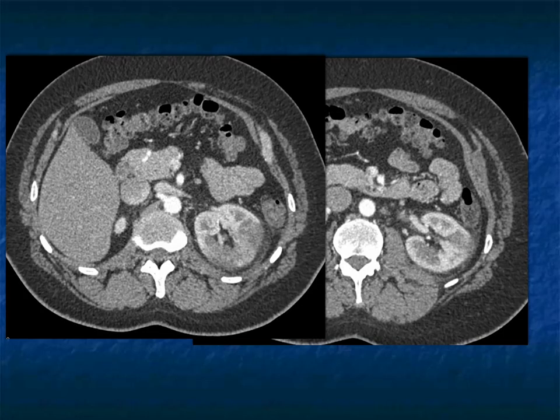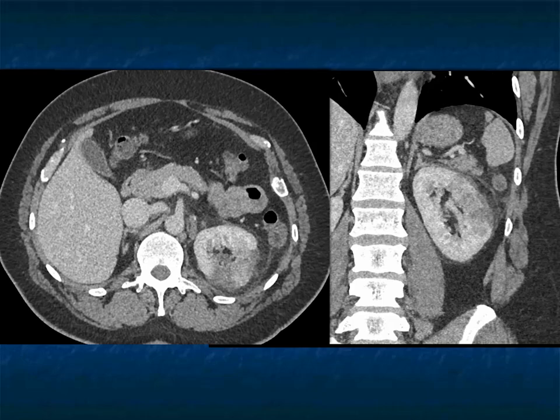When you give IV contrast, here's about a 30-second scan, corticomedullary phase. You see multiple areas of patchy decreased enhancement in the left kidney, very classic for acute pyelonephritis. The stranding, the low density, and the lack of sharp margins pushes you to infection. In case you were thinking about infarction, usually things are better defined.